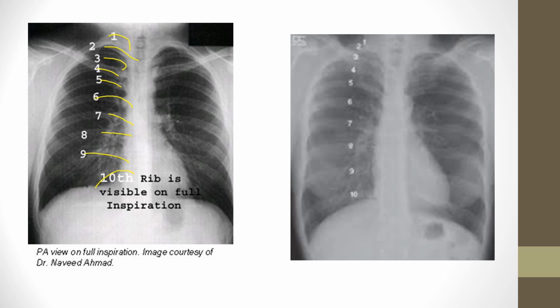So when you're looking at this, if it goes up like a McDonald's arch, it's posterior. So think about the thoracic cage. If you remember our skeleton in the lab at Pima, the ribs curve up posteriorly and then they curve down anteriorly. So you see these little shadows here that curve down? Those are anterior ribs. So you're seeing the shadow of the anterior ribs that curve down. But if it curves up like the start of an arch, that's a sign that it's a posterior rib. So that's a good way of looking at it there.